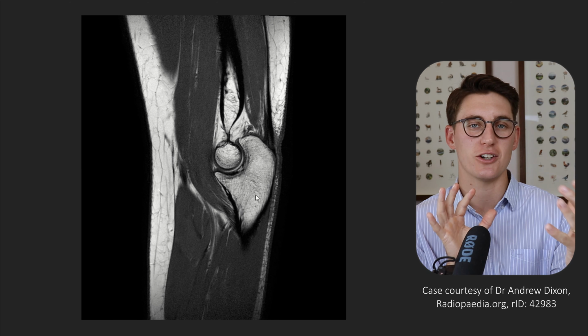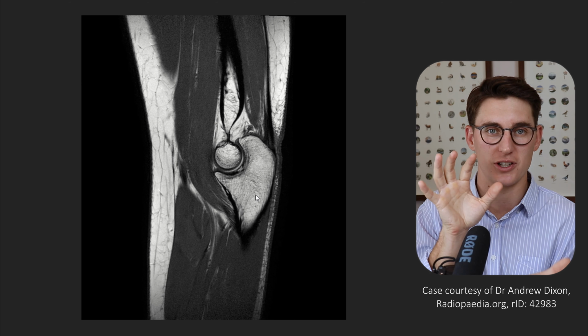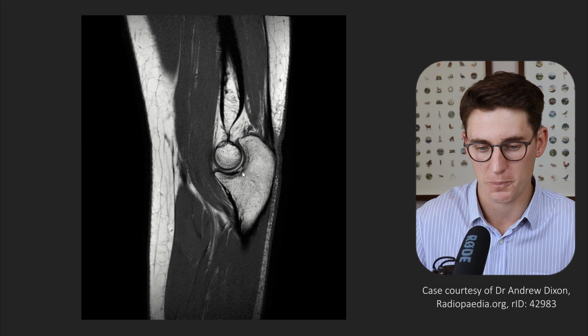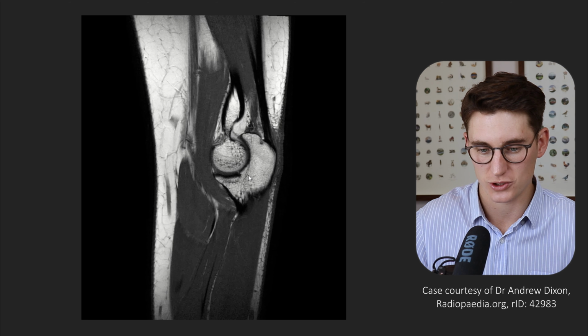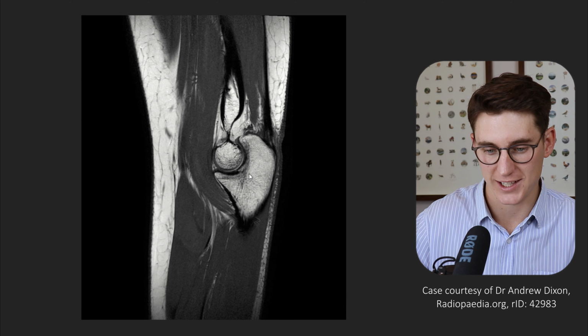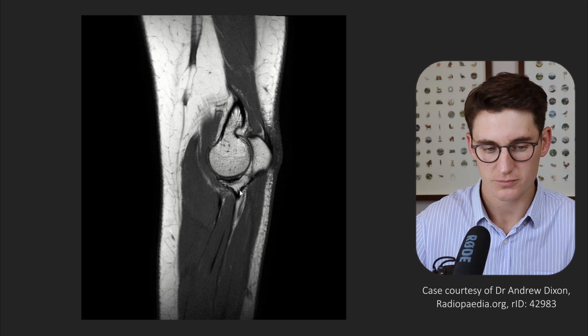If we were to look at the articular surface of the olecranon and that coronoid process in that trochlear notch, there's actually a small gap between that cartilage, which is normal. That small gap gets bigger as we head out laterally. See how much bigger it gets. And if we head out medially here, it also gets bigger. So on the peripheries, that trochlear ridge becomes bigger. That's not a foreign body. That's not a disruption of the cartilage there.